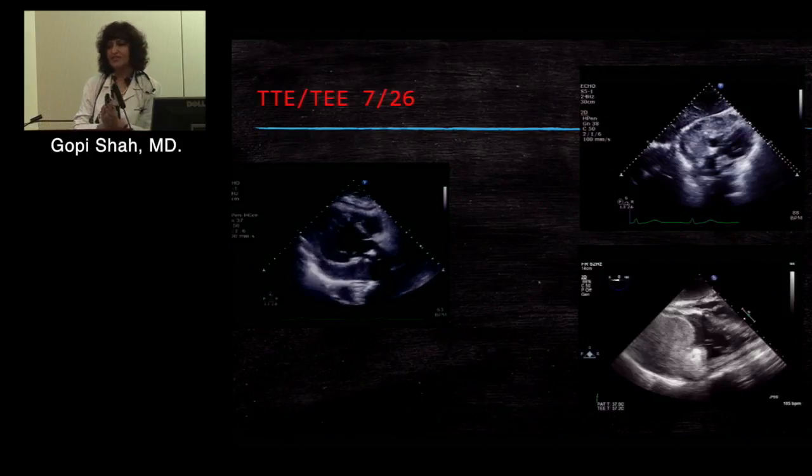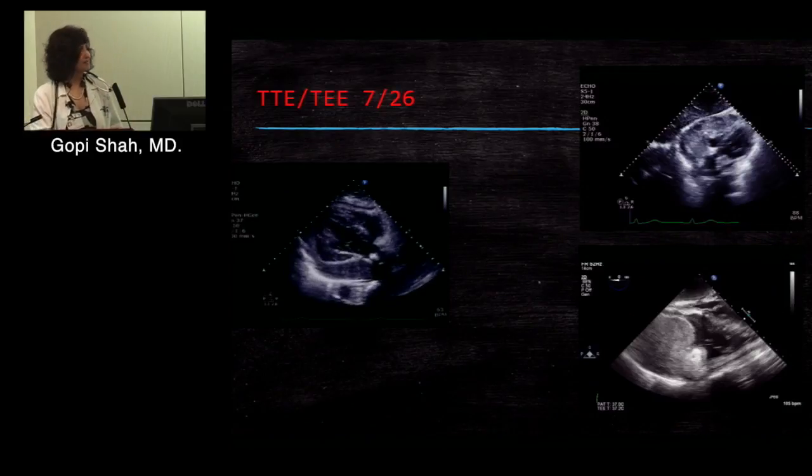What do you see? So this is 2 days after the first one. Should I point and ask you what you're seeing, or do you want to tell me? There is an echogenic area in the posterior pericardial space that seems to be maybe bleeding. Again, it's not completely echolucent. So again, a very echogenic collection posterior to the base of the heart and LA. You are hardly seeing the LA. Descending thoracic aorta again, so indicating it's in the pericardial space.